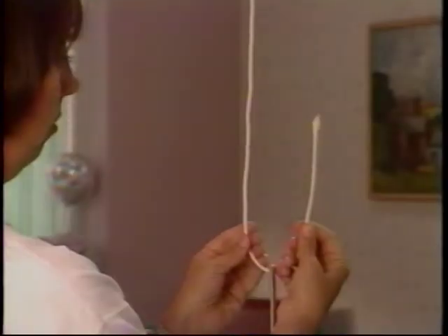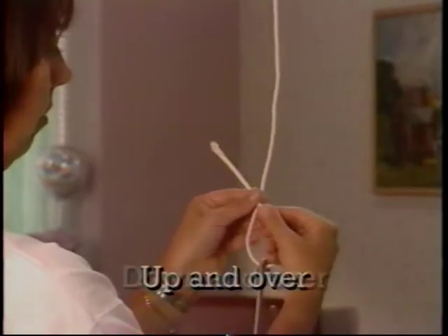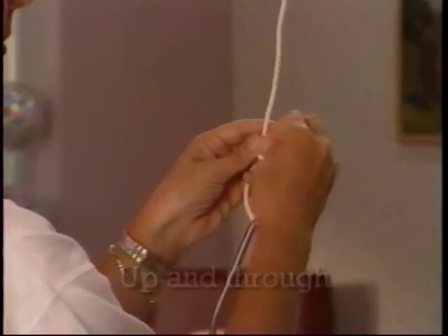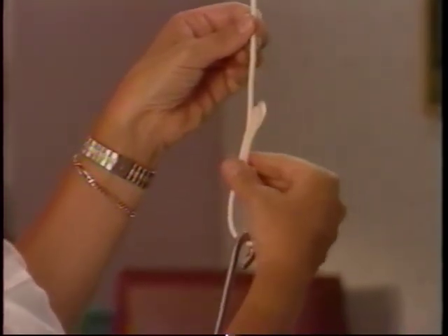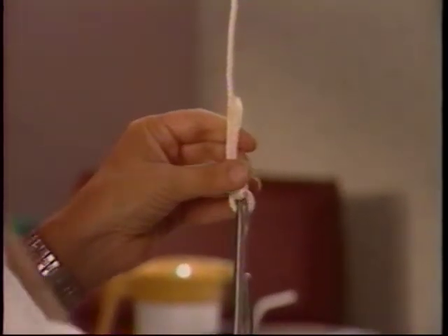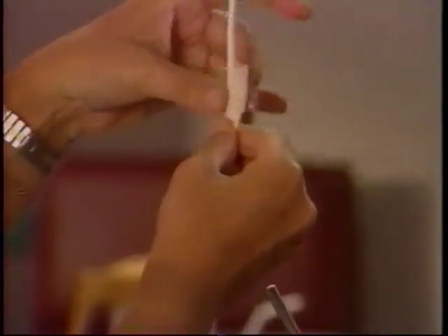When learning to tie a traction knot, remember this simple phrase: up and over, down and over, up and through. After you have tied the traction cord, allow about 2 to 4 inches at the end. This will allow you to later adjust the knot without having to replace the entire cord. Also remember to secure all knot ends with tape.